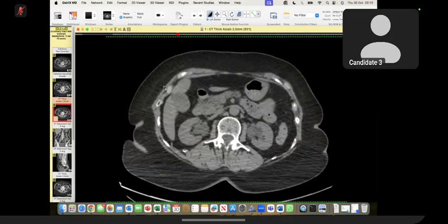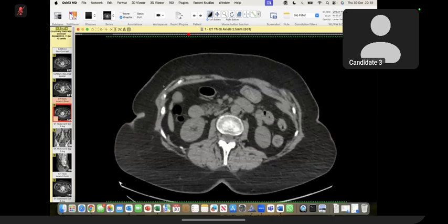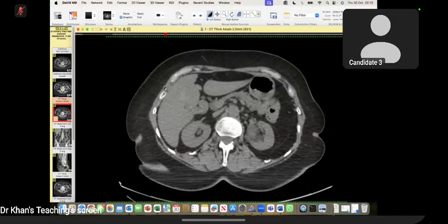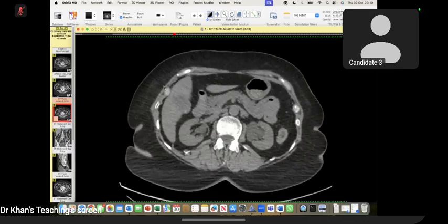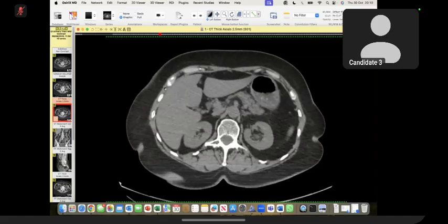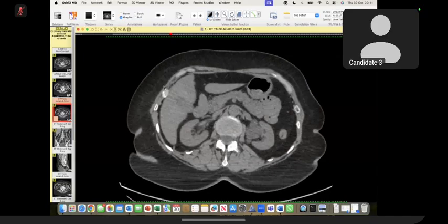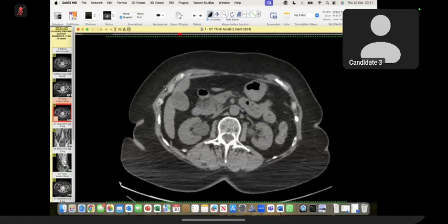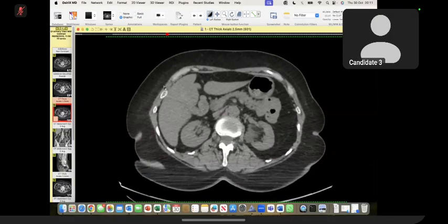And the upper third of the ureter is of normal caliber, so this can be either a bilaterally dilated pelvicalyceal system with an intracalyceal component that results in this isodensity, not hypodensity, or it can be bilateral intrapelvic calyceal lesions, which I don't think so. I'd like to know if there is a post-contrast image.